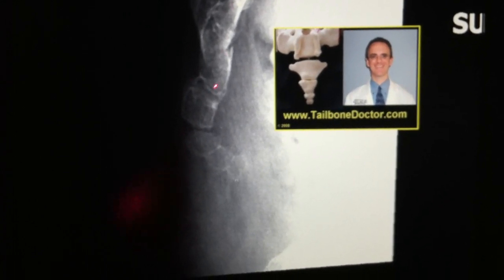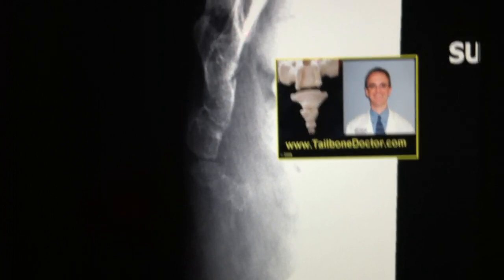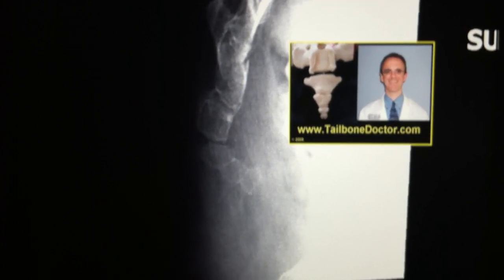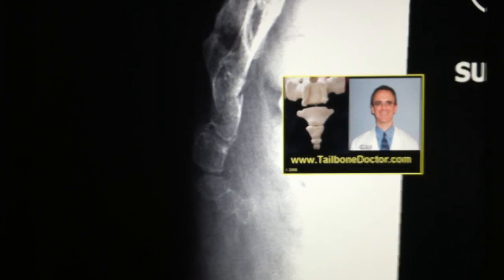Basically what I'm showing here is an x-ray right here. And I kind of have a laser pointer, I'm just on my computer monitor here. But basically the sacrum will be up above, and this will be the coccyx down through here. I'll lead you through the x-ray step by step.